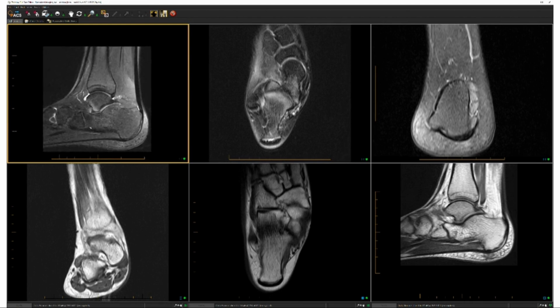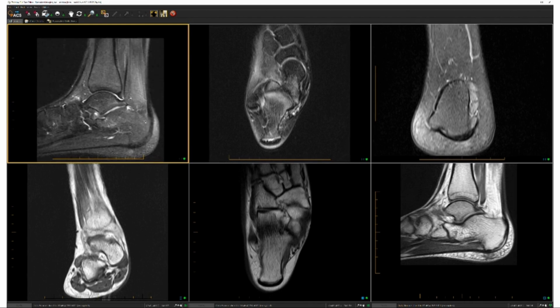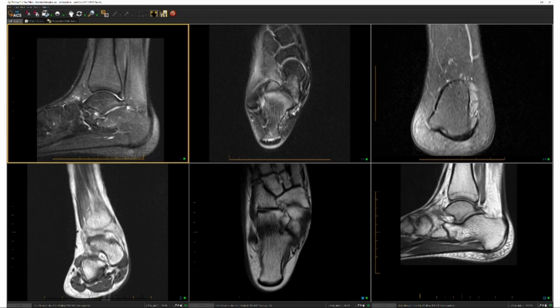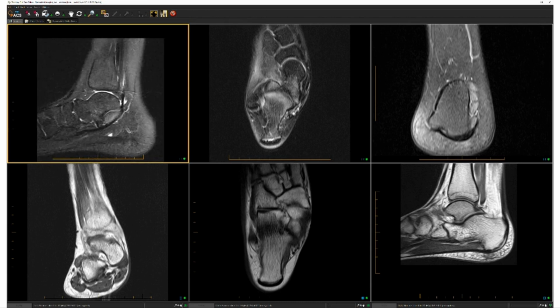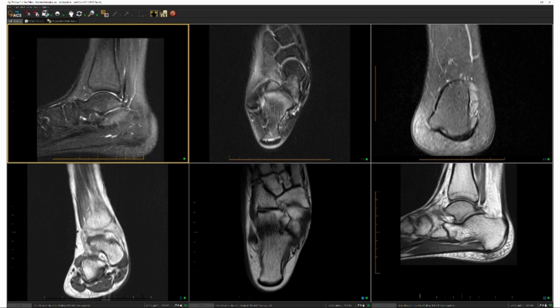Remember, the patient's only 14 years old, so I don't expect them to have what would look like a chronic long-term tear in these regions unless they were an athlete. But these are early findings that can be abnormal in the pediatric population. So we want to have a clinical correlation as well to these findings.